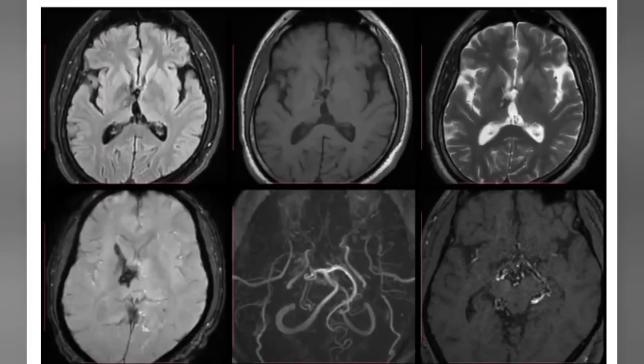I'm provided with multiple MRI slices of an adult patient with T1 weighted images and T2 FLAIR images, T1 weighted images and T2 weighted images, and the contrast study and angio. So I can see some abnormal intensity lesions which are scattered bilaterally in the white matter.